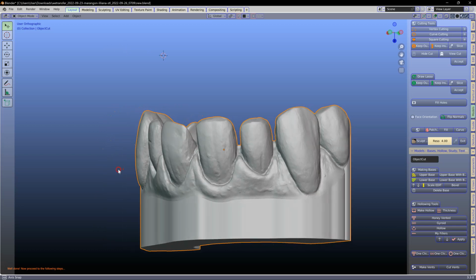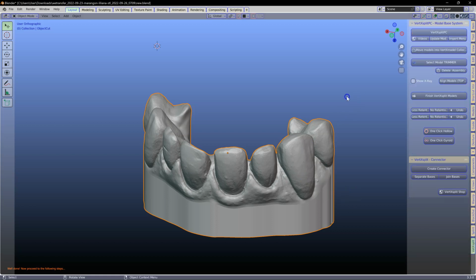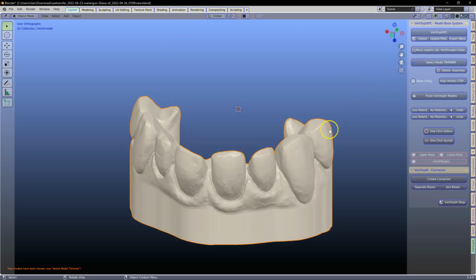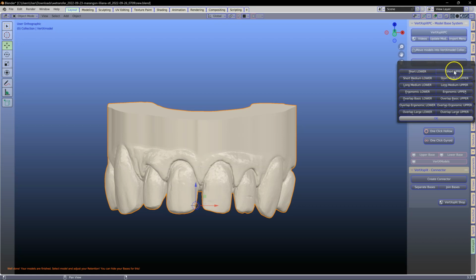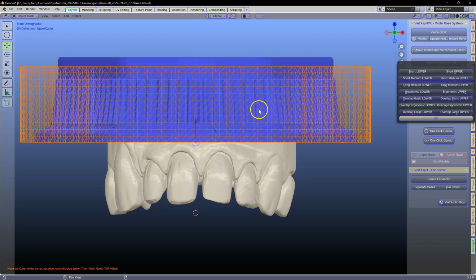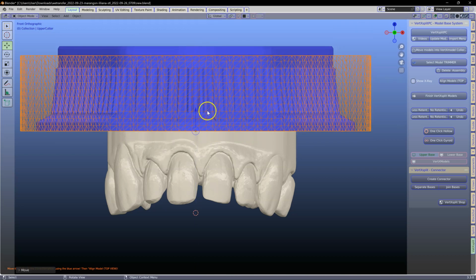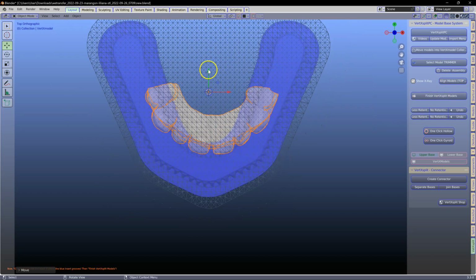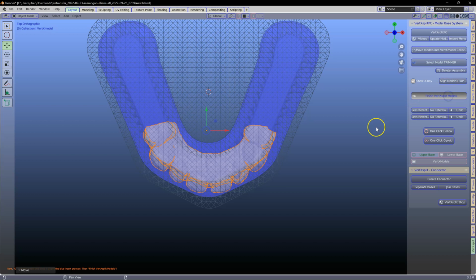Alright, this is looking quite nice. I'm going to go to the vertex split over here. And the first thing that I do is I'm going to move this model into the collection. Then we're going to select our trimmer, my model trimmer, and we need to get an upper one, not a lower one. So put this where it needs to go, somewhere like that. Then go to align models, and then align this into that, like that. After that, we're going to finish the vertex models.